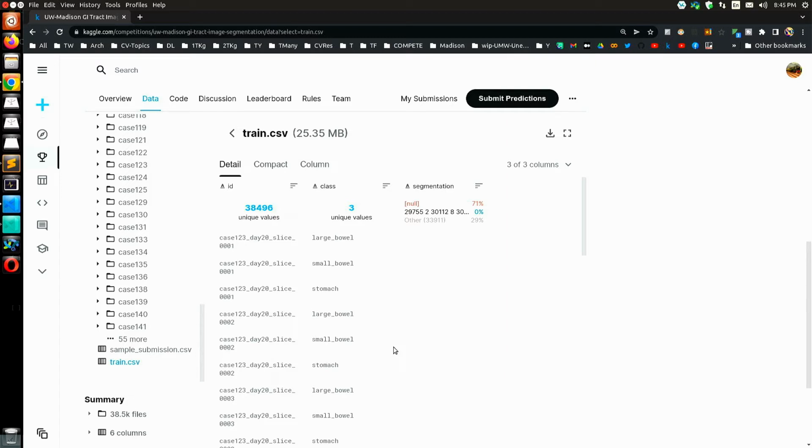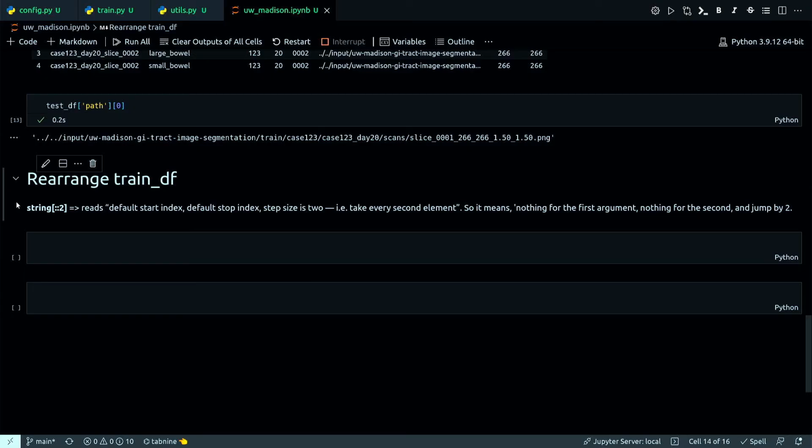And now what I want to create is 3 extra columns with the same segmentation names and assign corresponding values. So what I will do is create a method and extract those 3 column values.